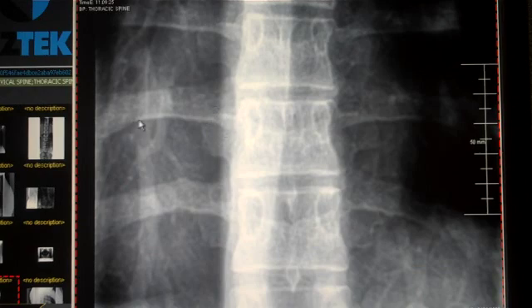Now the rib is coming in, of course, right here, articulates with the vertebral body, up here with this vertebral body, and then there's the top edge of the rib right there. Of course, again, where it articulates with the transverse process is called a costotransverse joint. Where it articulates with the vertebral body is called a costovertebral joint.